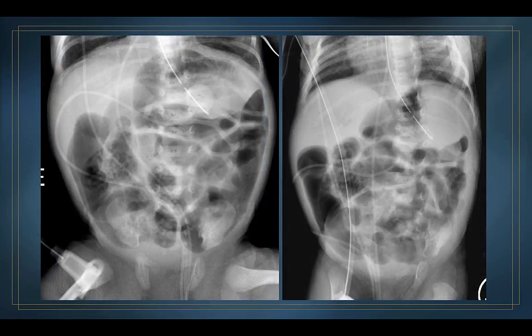This is a pseudo cupula sign. All right. Generally you don't have bowel loops overlying the liver, and you don't have bowel loops extending higher than the stomach. But if you have diffuse bowel distension, both of those things can happen. So this is actually a loop of bowel and should not be confused with a cupula sign. And the decubitus sort of proves it.